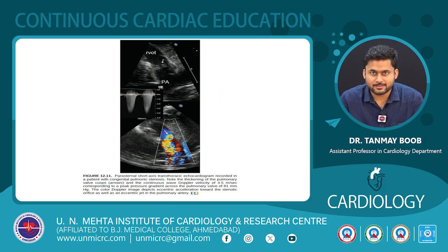This is the modified short axis view in patients with congenital PS. The second image demonstrates the Doppler with peak velocity of around 4.5, which indicates severe PS with peak gradient of around 81 mm of Hg. The color Doppler image depicts eccentric acceleration towards the stenotic orifice as well as an eccentric jet in the pulmonary artery.